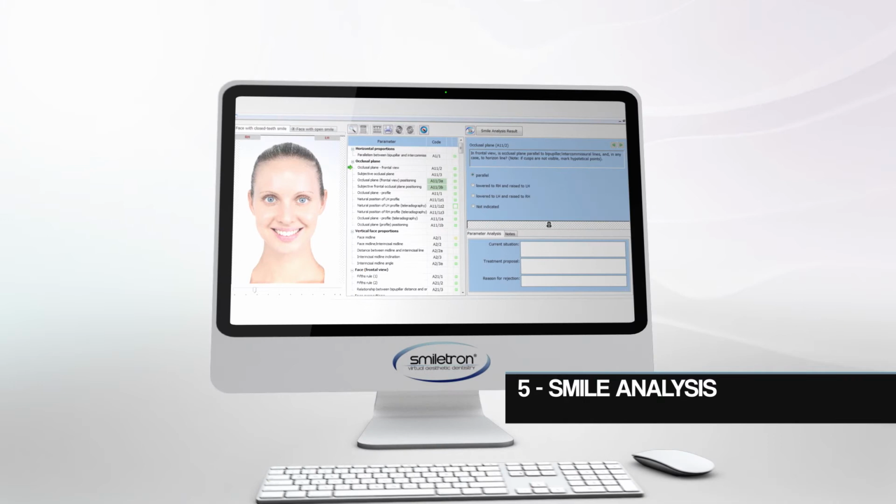In a few seconds, it processes nearly 300 parameters and automatically carries out a detailed assessment for the initial aesthetic classification of the patient to identify the best course of treatment and bring face, lips, and teeth in harmony.